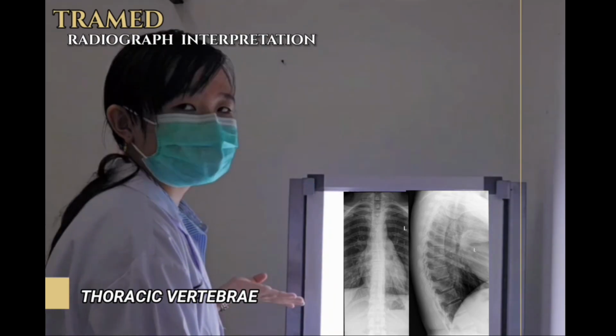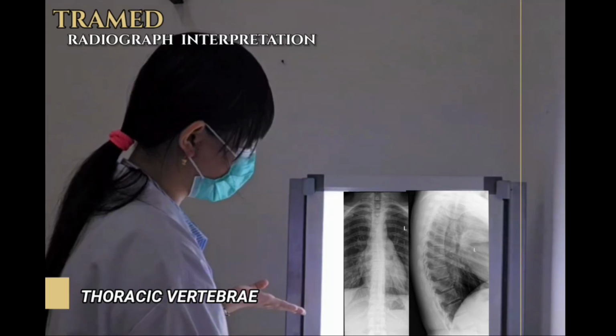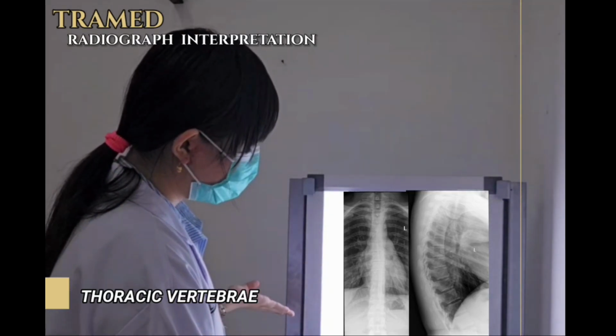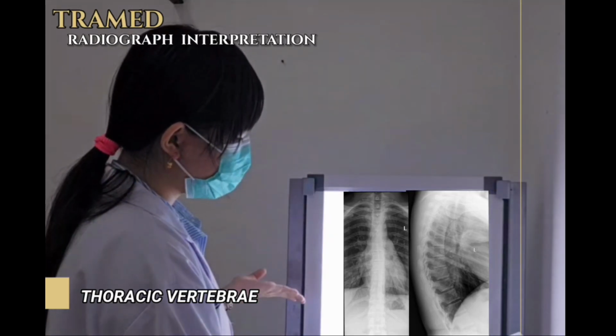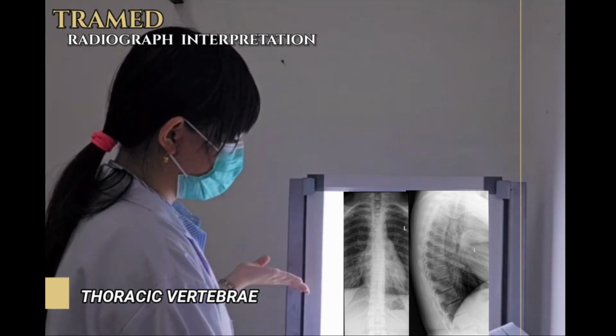And the next will be to evaluate the image adequacy. The first will be the thoracic vertebra, lateral. For the penetration, it's adequate, it's normal, and after that the intervertebral joint and neural foramina are open, and the spinous processes and posterior ribs are superimposed. It's normal.